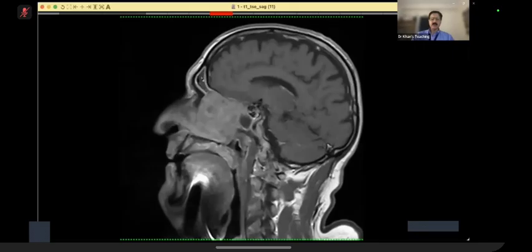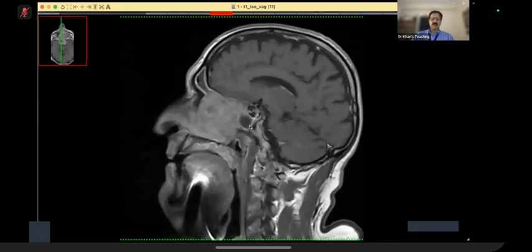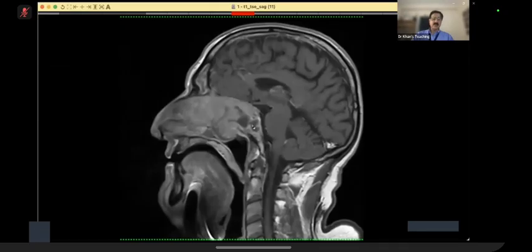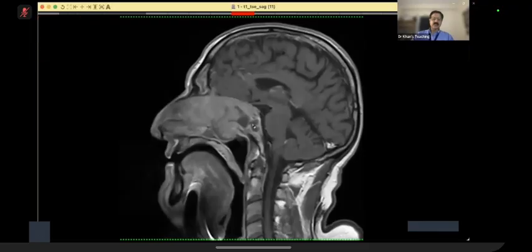Surrounding enhancement, but there is trapped fluid. You know that the tumor is not going into this sinus. And there are pockets of fluid within the lesion itself. Please remember that nasopharyngeal carcinoma particularly presents with indolent clinical signs. So this patient had sinusitis since ever, and the patient thought that this is all sinusitis. There were many visits to the ENT in the past years. Again, there was a tumor sitting within that sinusitis.